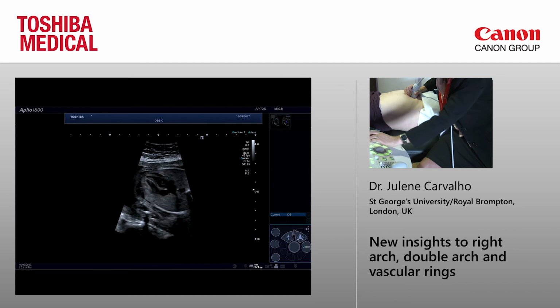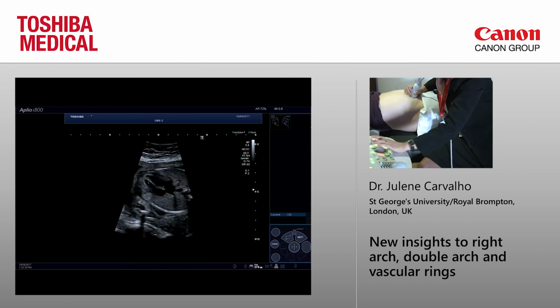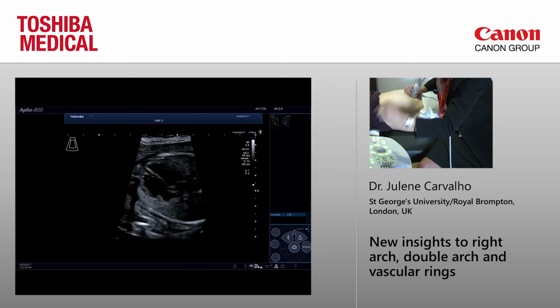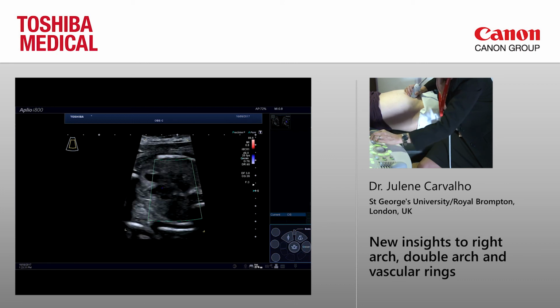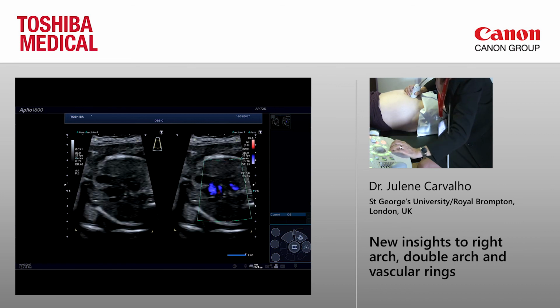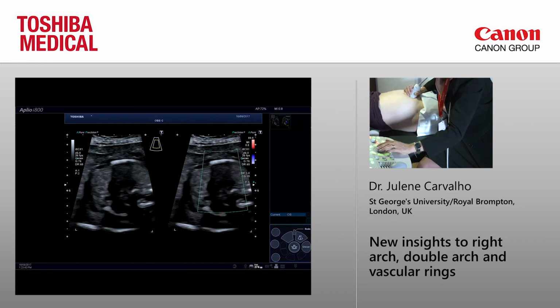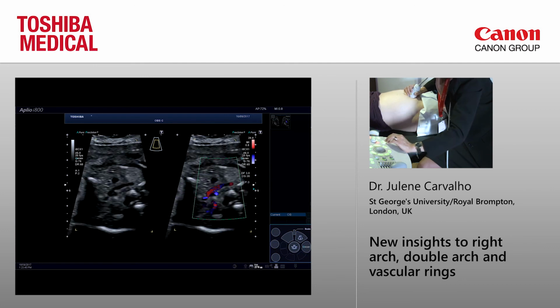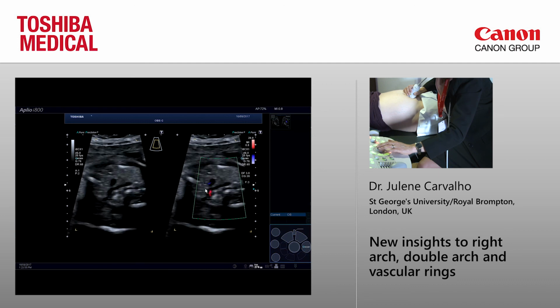Innominate vein, okay. So the innominate vein is... Sorry, let's make this bigger. It's high in the mediastinum. It's usually above the aortic arch. So if we come up in the mediastinum, maybe I split the image. So you can see the SVC here, yeah? So the innominate vein is joining up the jugular, coming into the SVC. So the direction of flow is going to be from left to right, yeah?